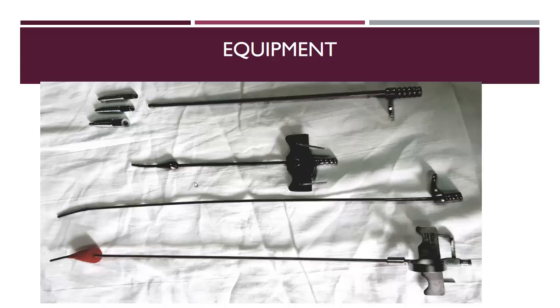And these are the cannulas used. I prefer this one, the corkscrew type, because it fits well to the cervix and there will not be contrast leaking outside the cervix. Here is another one with this bulb in order to fit to the cervix. There is this narrow one and this one with a rubber part.